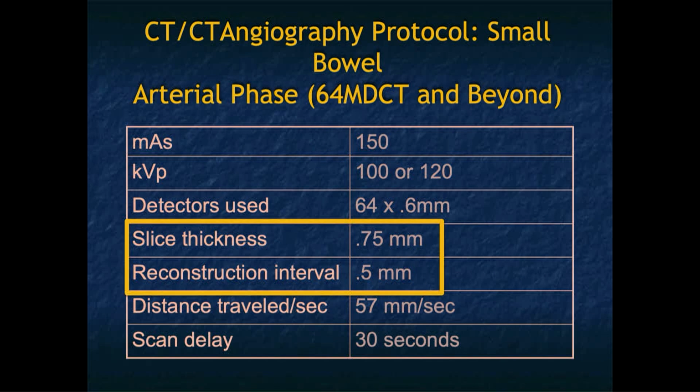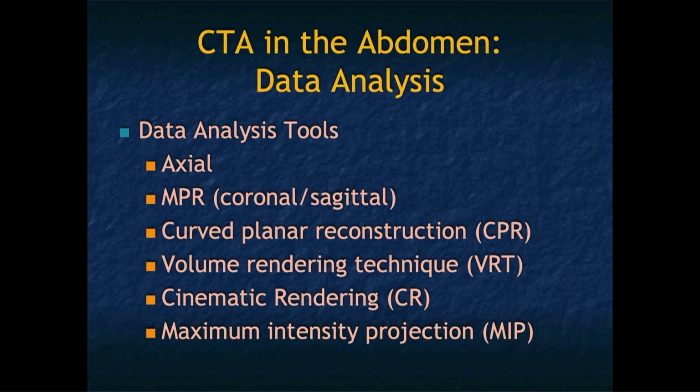As I'll show you from the cases, looking at axials only, as we all know, is not enough. The role of multiplanar and 3D imaging, particularly MIP and now cinematic, becomes very important.